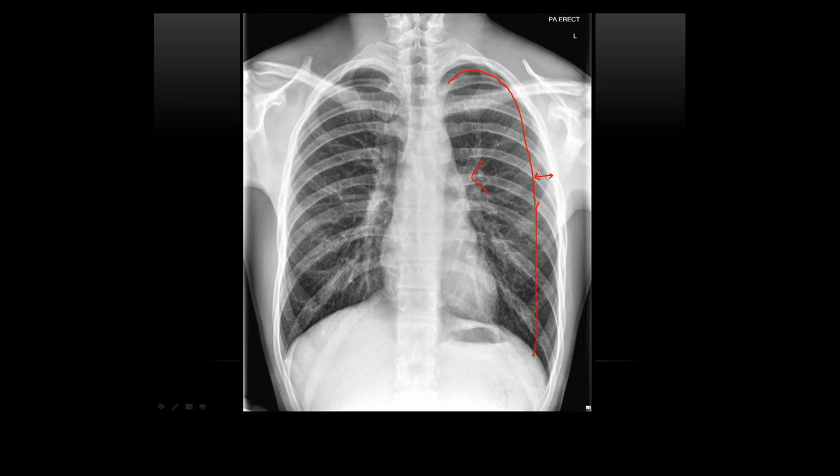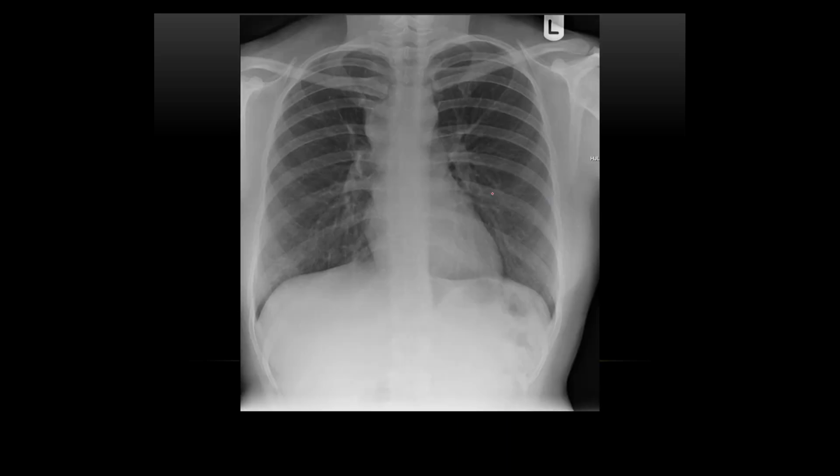That's when you measure from the level. At the hilum, yeah. If it was on the other side, obviously it'll be a little bit lower down, so you measure it around there. Yeah. Okay, next one.